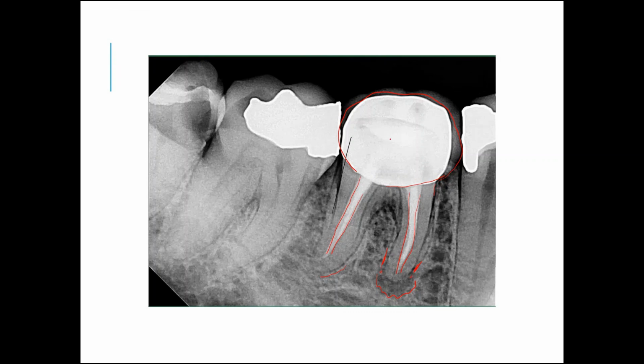Once we are done with the tooth of interest, next let us analyze the adjacent tooth. In 37, we can see in the coronal part there is a well-defined radio-opacity suggestive of a restoration present on the occlusal surface of the tooth. Radicularly, it appears normal, and periapically also there is lamina dura as well as the PDL space. Interdentally, it appears normal, and the partially seen teeth are 38 and 35.